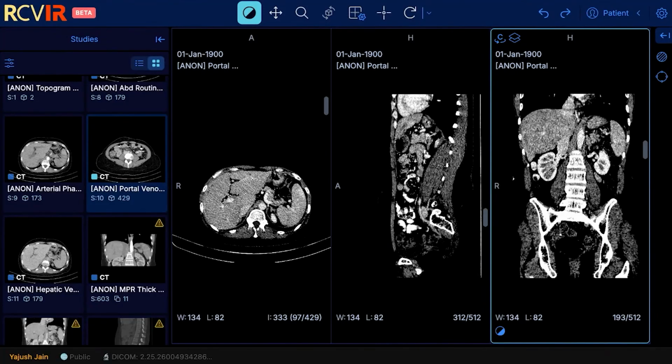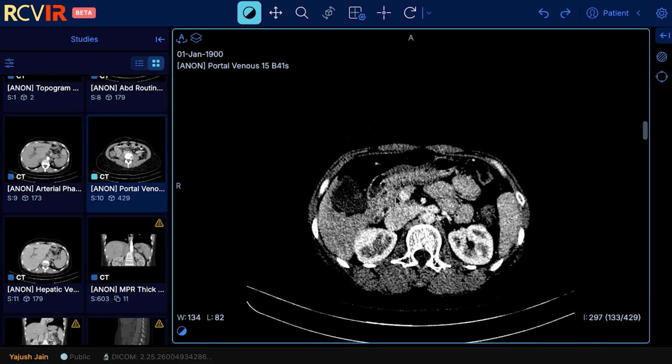We have a post bone marrow transplant patient with features of acute liver failure. In this setting, we always suspect a microvascular veno-occlusive disease, but we must check for the major vessels first. So now let's deep dive into the axial cuts, CT axial cuts of this patient.